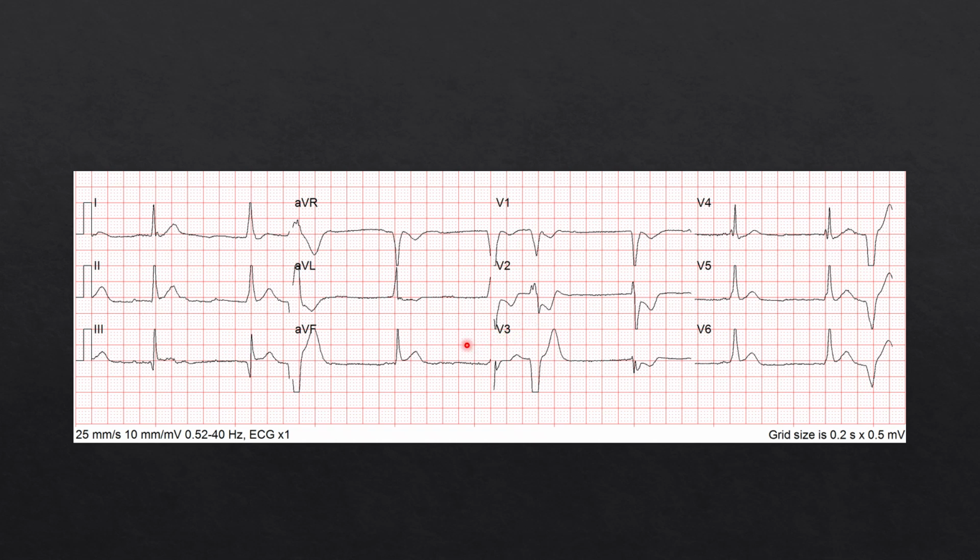So this patient also had some other signs. If we scour over, nowhere in here do we really meet STEMI criteria, but remember, we're suspicious of posterior. And just to close out the case, they did do a posterior and it was positive. It had ST elevation on the posterior. But if you look over even on the initial, if we remember, the posterior is often perfused about 60% of the time by the RCA, which also gets the inferior. If we look over, we see some warning signs here for early inferior MI as well.